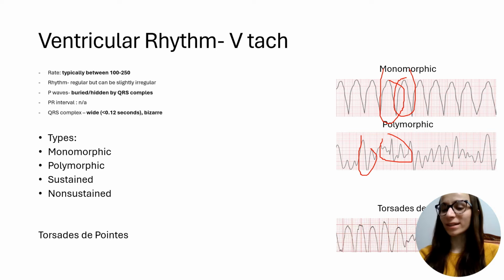That's pretty much why it's called that, because Torsades de Pointes, I believe it's a translation from French, means twisting around the points. So that's basically how it looks in Torsades de Pointes. As you see, it's twisting around the point or the middle. Just so you should know, usually you'll see a prolonged QT interval first, and then it will go into that, which is why QT prolongation is important to watch out for, because this rhythm could degenerate into ventricular fibrillation, which is a life-threatening arrhythmia. So that's why you want to treat it quickly before it goes into VFib or something else.